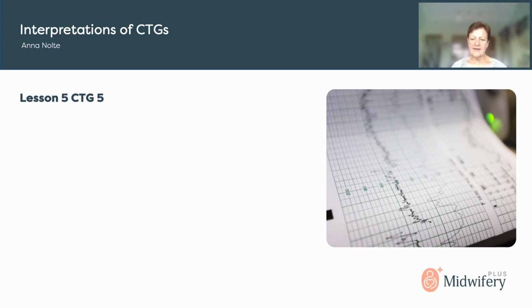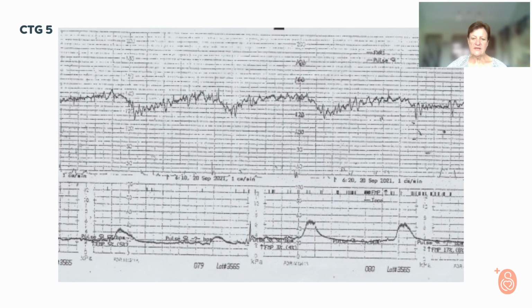This is the last CTG to interpret before you get to your final test of interpretation of CTGs. And again, it works like all the previous ones, where you had to interpret the CTG before you come to this lesson, and here I will just interpret it for you and show you how to classify this and how to manage this. Again, this was the CTG that you had in front of you that you were supposed to interpret. So let's look at it in more detail.